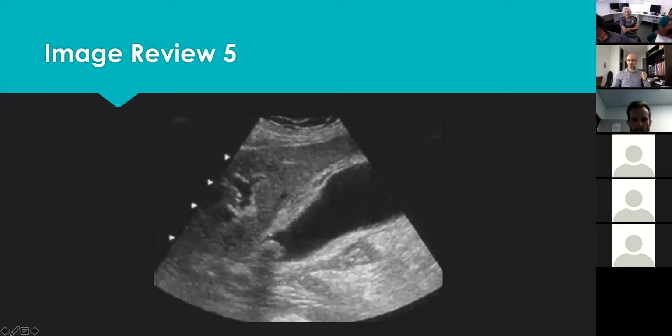And this, for example, might be because the focus is not exactly in that area. The lowest part of the focus is in that area, but most of it is above this area, looking at the gallbladder wall, because they are focusing on that thickening of the gallbladder. And I do understand that, yes, you're right, this is the area that is not perpendicular to the ultrasound, and that's actually smeared out a little bit.